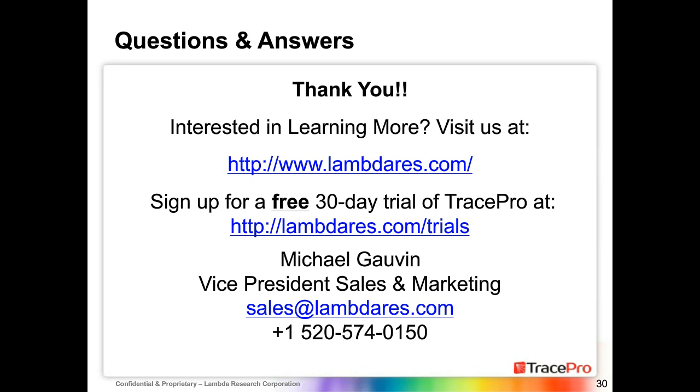Now, right now we're not doing the bulk scatter, but we should be able to do that in the future with the product as we come along. Right now we're just doing the stray light issues and things of that nature where we're seeing crosstalk and properties. So in terms of the bulk scatter, we haven't got it there yet, but in terms of all the other things that I've been showing, RayViz does have that capability. And since it's a SolidWorks add-in, all you do is add your optical properties to the system tree. You then quickly trace the rays, and you can see the visualization of those rays directly in your SolidWorks system view.